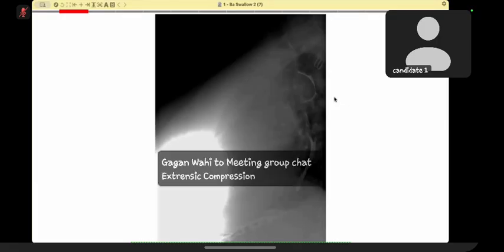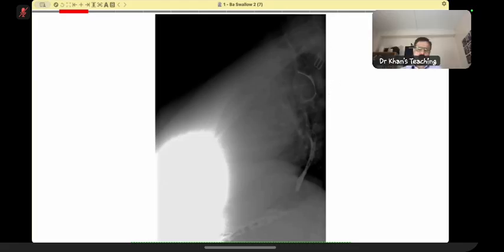In benign etiology, these are the top two differentials in my mind. Can it be malignant? No, because there are no ragged edges, no irregular mucosal irregularity, and no holdup of contrast. Malignancy is less likely. Okay, thank you.